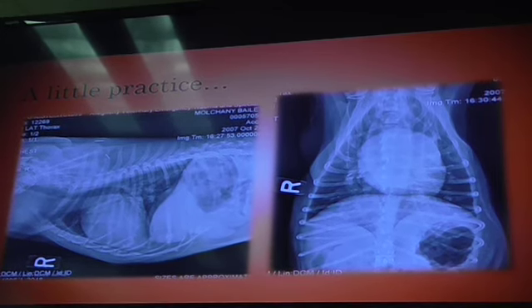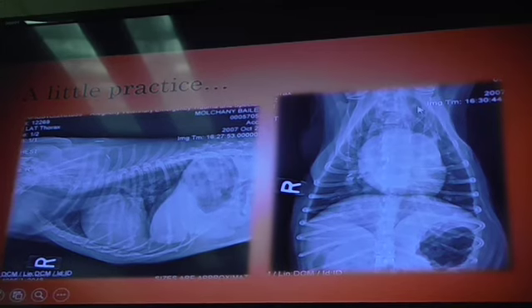And we look at these things, right? So this area is actually just the left lung lobe, but you're seeing or wanting to see a difference because you have the mediastinal region here, which consists of the aorta and other mediastinal tissues. You have this spine, so it makes it seem like you're demarcating the area, when in actuality you're not.